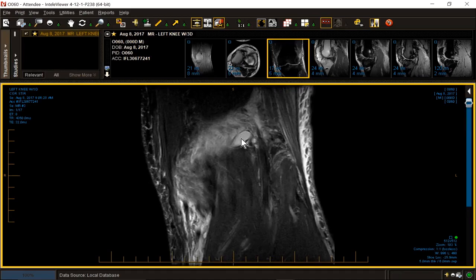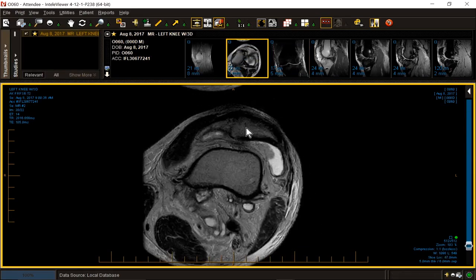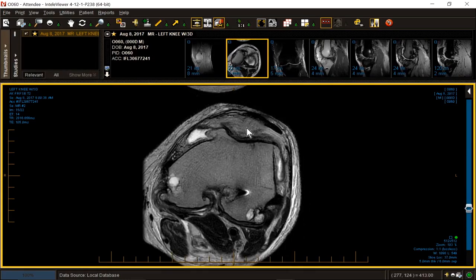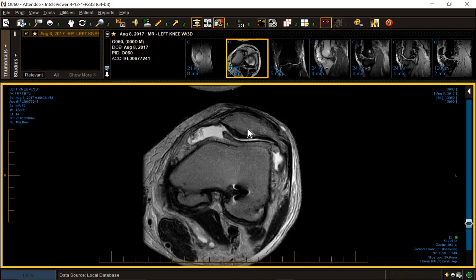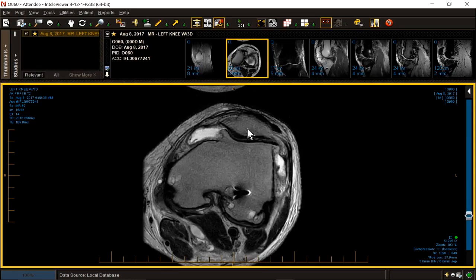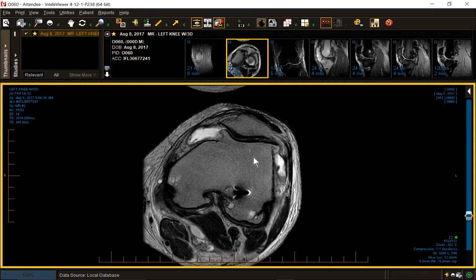Okay. Start out with the axial. This is a well-known American football coach. He's a hard worker. He never takes a day off. His calf is twice normal size. He goes to the emergency room, finally, after pleading from his trainers and doctors.